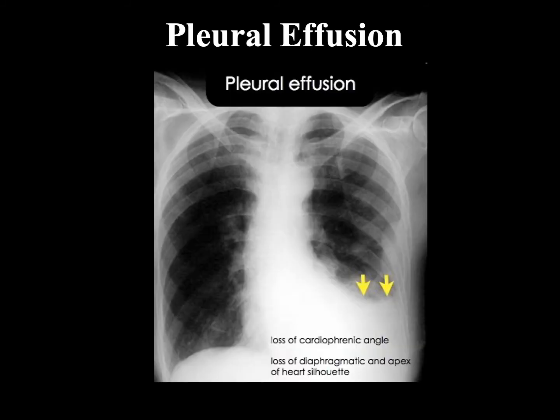Then you've got this pleural effusion. So you've lost this cardiophrenic angle and loss of the diaphragm. You cannot see the diaphragm here at all. So this is a lot of filling in here of water content.